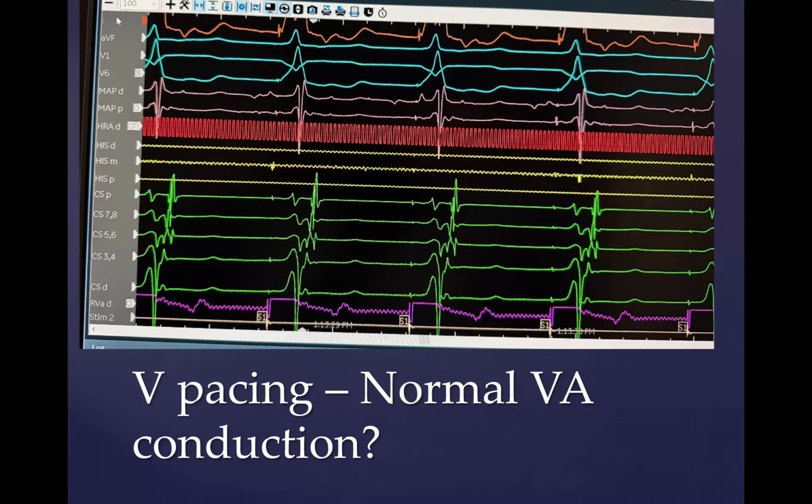So this is actually, well, that's always the case. Now, it could be that people display it differently. Sometimes some electrophysiologists will display the distal on the top and go more proximally. And one of the confusing aspects that both Barry and I do is that we go distal to proximal on the His, but then in the CS we go from proximal to distal, which is a little confusing, I know, but this is more a habit than anything else.